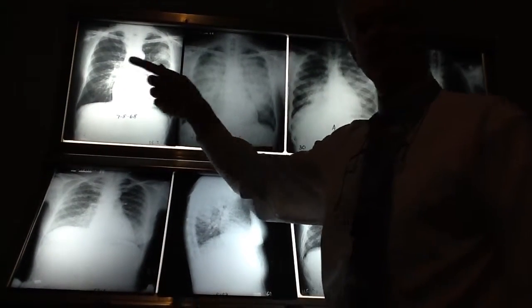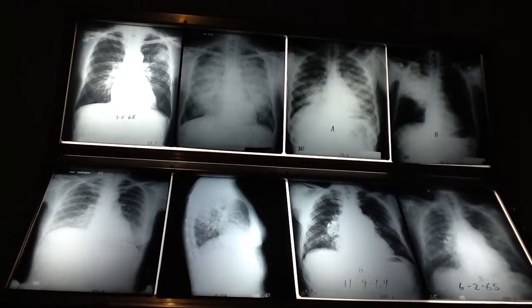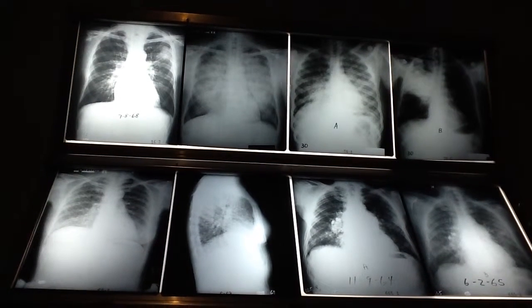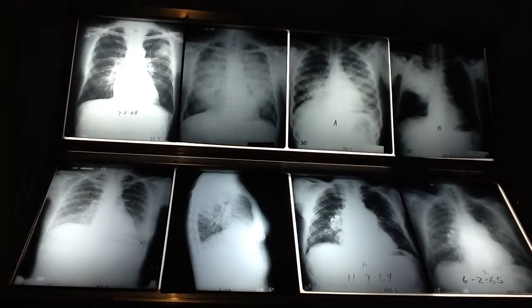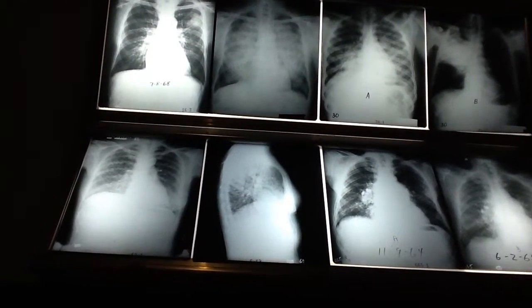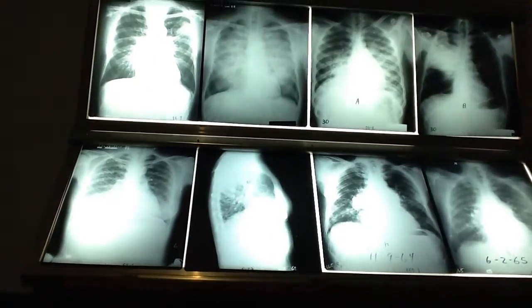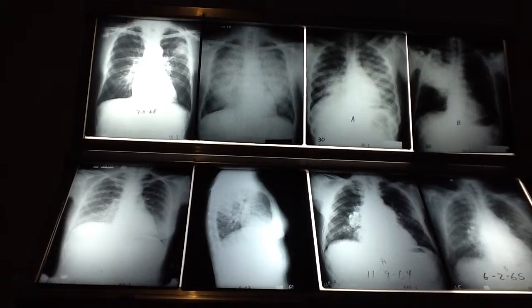In the upper left, there's an increase in density, and it's unilateral, localized to the lateral portion of the upper left lung field. Okay, what kind of a border does it have? It's a fuzzy border, isn't it? What's the distribution? Remember number 6 of the 7 signs of airspace consolidation.